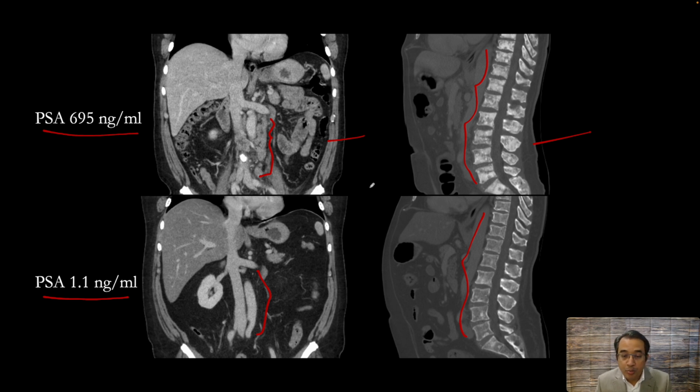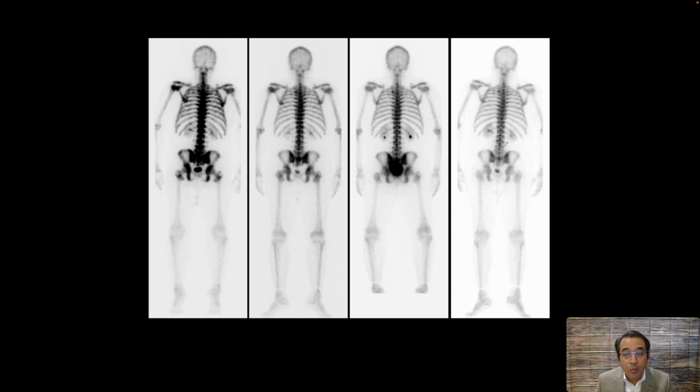post-treatment, or 6 months post-treatment. The PSA dropped to 1.1. The interesting finding is in their whole body bone scans, and looking at the CT image and diffuse involvement with osteoblastic bone metastases, we can expect a Superscan pattern at the time of the diagnosis. So this is their first whole body bone scan showing a Superscan pattern. We see intense uptake in the spine, pelvis, scapula, and ribs, with faint uptake in the kidneys and urinary bladder and very faint soft tissue activity consistent with the Superscan pattern.